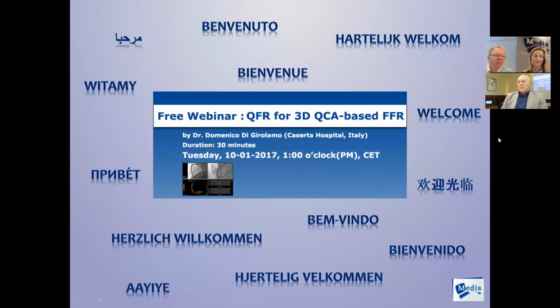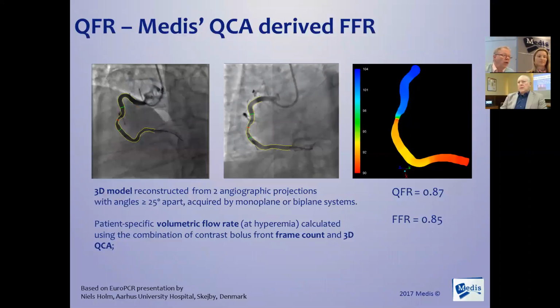So welcome to this webinar. I just want to give some additional background information about QFR. So the QFR is one of the parameters from QAngio XA 3D, our QCA software for the 3D analysis of the coronary arteries. And it's a QCA-derived version of the FFR value.